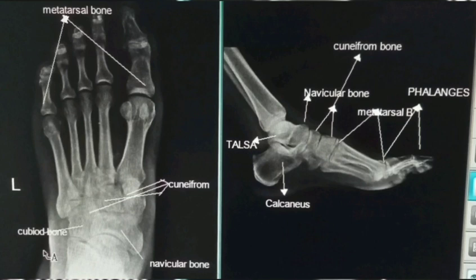The calcaneus, which is also known as the heel bone, serves as the insertion point of the Achilles tendon. We can see from this view that the cuneiforms are named medially to laterally. You can either refer to these bones as the medial, middle, and lateral cuneiform, or the first, second, and third cuneiform. The cuboid bone is the most lateral in this row of tarsal bones.